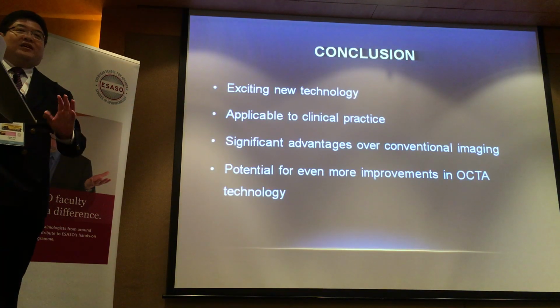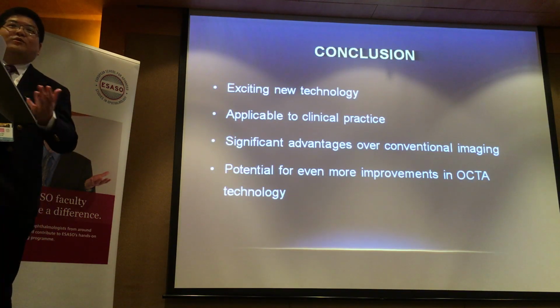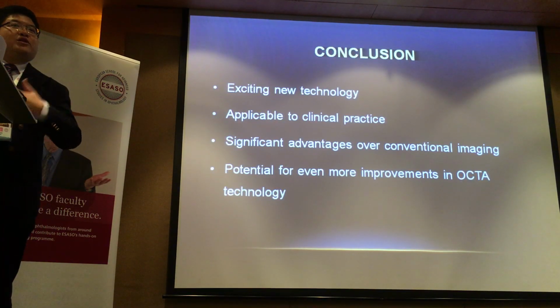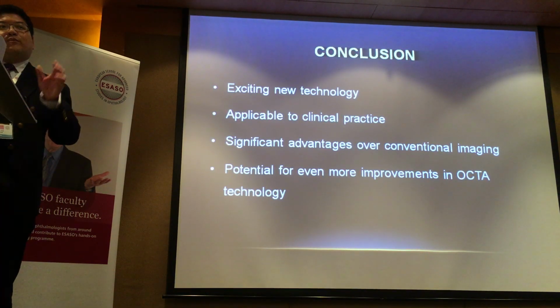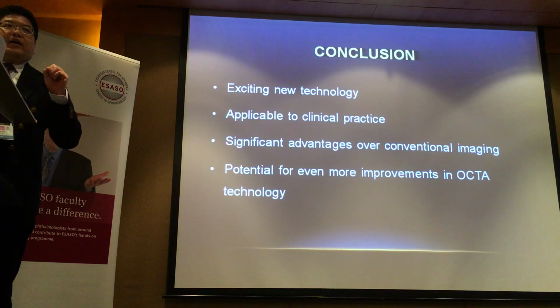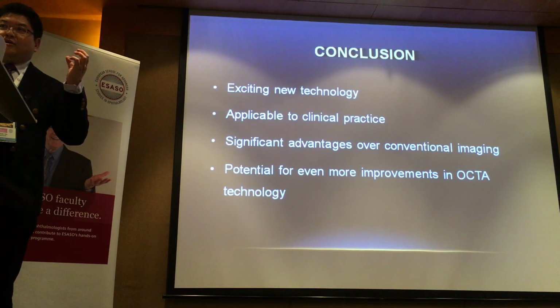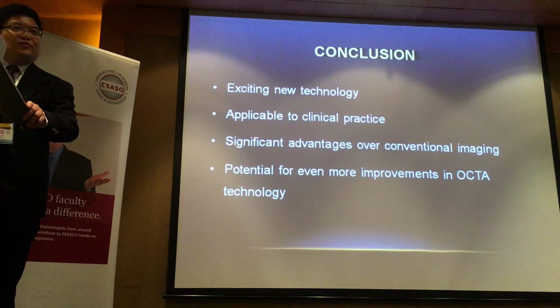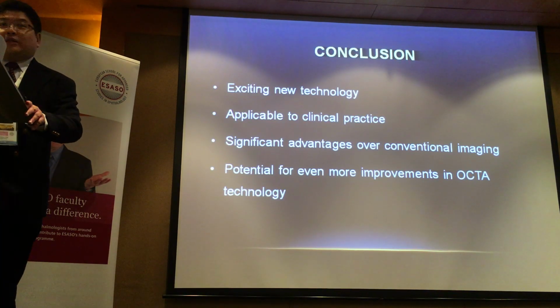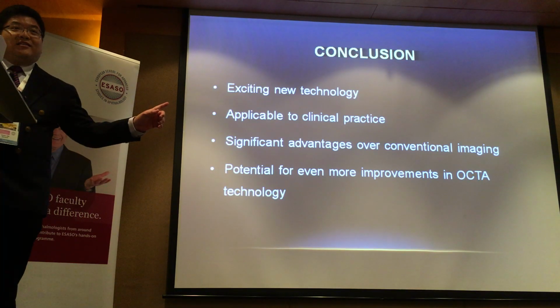But what was that? It was an ungradable image. It was full of artifacts. The patient couldn't hold his eyes still. And obviously, in such a situation, you're not going to get anything, all right? And indeed, there were a lot of errors. And when I corrected that, I could actually see on the small patches of usable scan that it was perfused. So at least the usable, visible areas were perfused. So question, do you PRP that? I will say that at least I don't see a justification based on that scan.